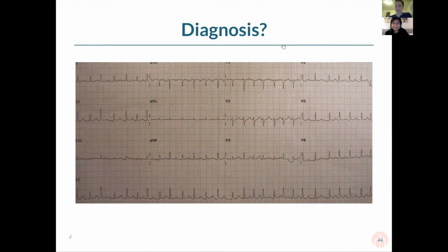Let's see. We have one more case here I think that we can fit in before we wrap up. Definitely shoot us your questions and hopefully we can get to everything you need. But this is one more that's very classic. If you have any ideas of what's going on in this EKG, I see someone already said the answer, or starting to send some things in. Someone said restrictive cardiomyopathy. That's very close. Not exactly what's going on here.